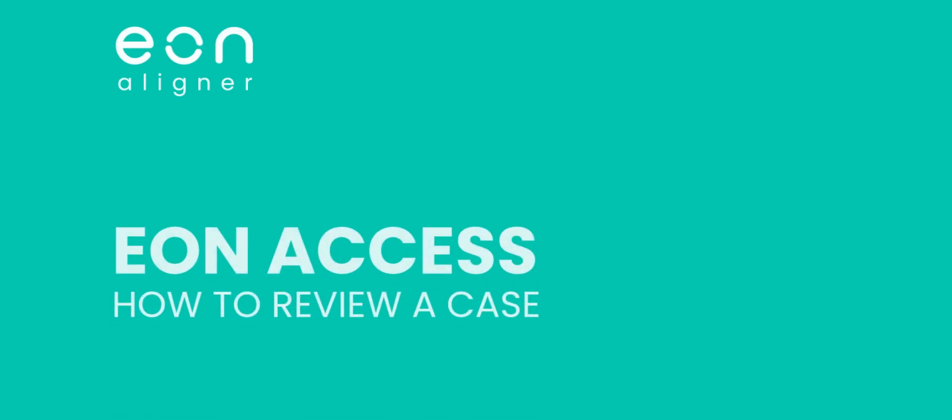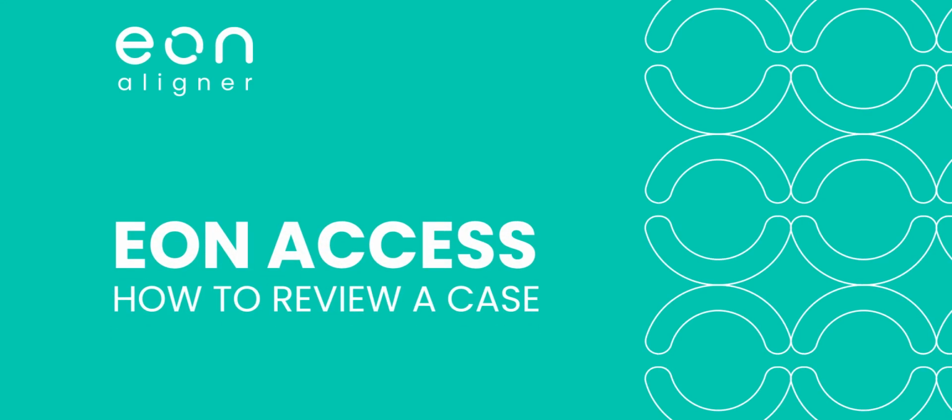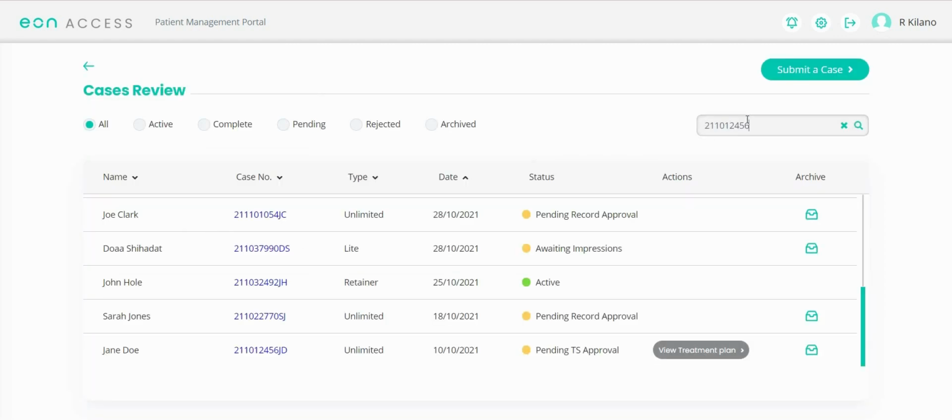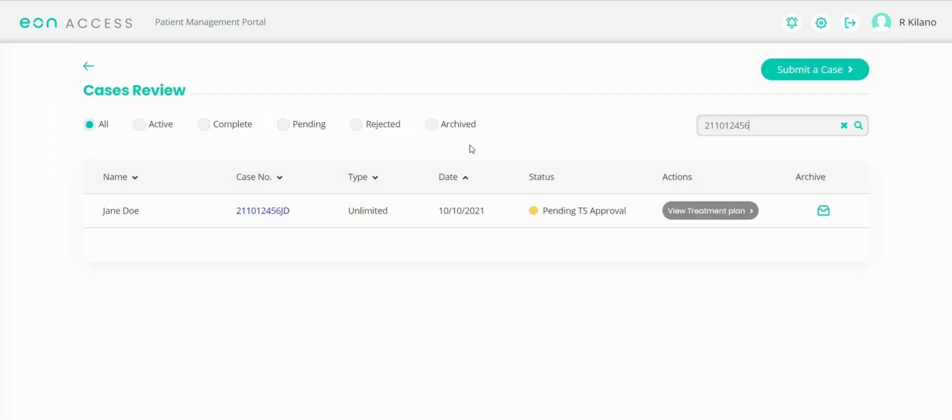In this video, we will show you how to navigate and evaluate the treatment setup. Once you're successfully logged in, click on Review Cases. This will take you to this page, where you can search for the case using the case number. You can either click the case number or View Treatment Plan to enter the case.